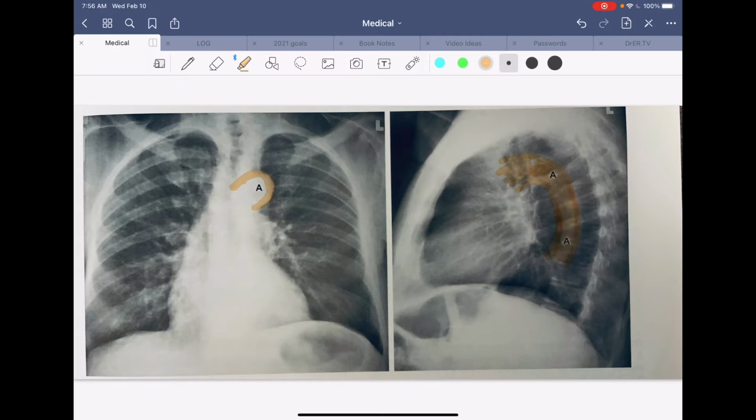And the reason is because in the elderly patient, the descending aorta is elongated or uncoiled, and it's also dilated and ectatic. That means the blood doesn't flow as fast. So having more volume of blood, of liquid, going through at any given time, when the rays of x-rays are trying to shoot through, the fluid actually stops some of that, so it makes the area more dense.